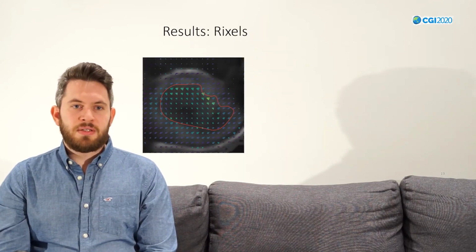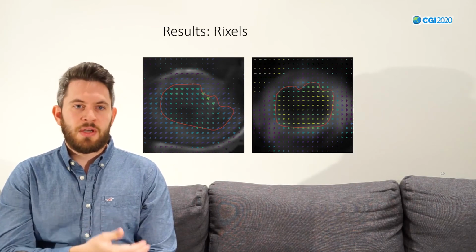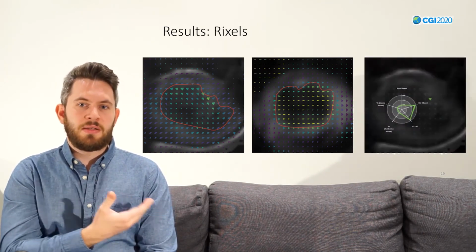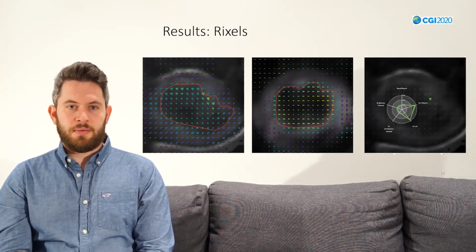For the Rixels, we can see here examples for homogeneous tumors and inhomogeneous tumors, and we can also nicely see in the tooltip what values are used for these Rixels and what they are presenting.